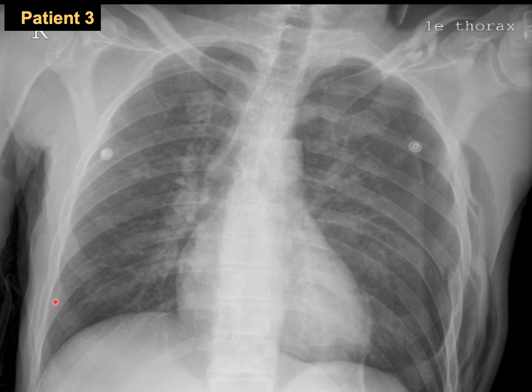Let's start with the normal one, or the one he is not complaining of. I think we can appreciate the lung field here and the diaphragm as well. If you go to the left side, the bronchovascular markings stopped here, and this is the lung border. Okay, I can locate it. Then this area is homogeneously black, or what we call jet black. Then this is pneumothorax, and if you continue to look, you will find the left copula of the diaphragm is pushed down, and this is the very deep sulcus. This is what we talked about earlier.